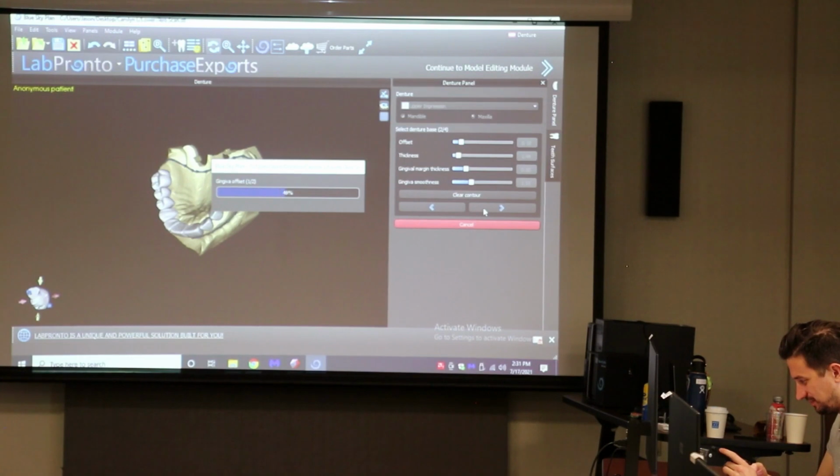Just add another point between them. So undo that. Okay, so shift drag one of those points closer. There you go.